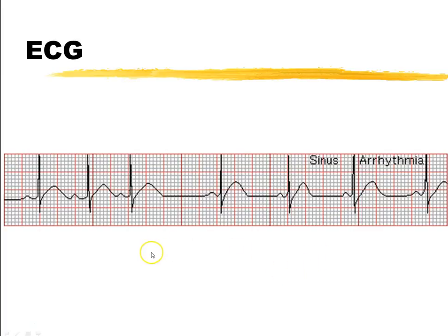So if you have an irregular rhythm here, but you have a normal looking complex every time, you have a P wave, it's got a normal distance here, the QRS complex looks normal, and a T wave. All of them look great. They look the same, but you still have this irregular rhythm, then that is called a sinus arrhythmia. That is the key characteristics.